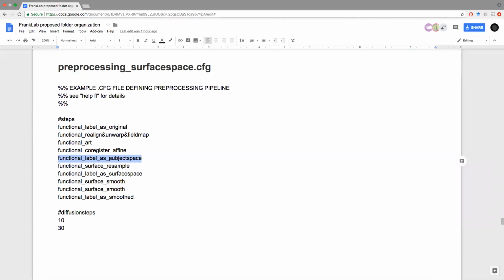It's trying to find the location of individual gyri and sulci features in the individual subject's brain. As opposed to MNI, which is volumetric normalization and just does some sort of matching of the 3D features, this is trying to match individual two-dimensional features. So basically, the location of gyri and sulci. It respects the anatomy much more than what MNI volumetric normalization does.